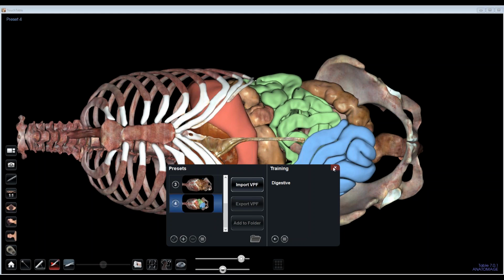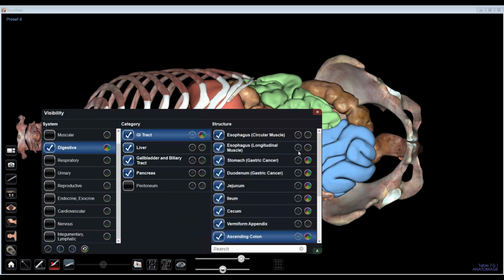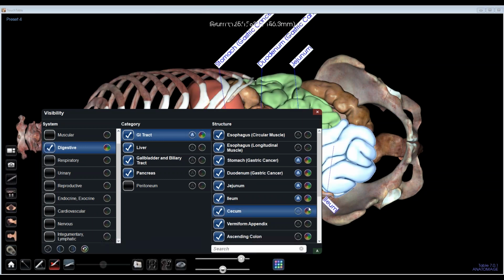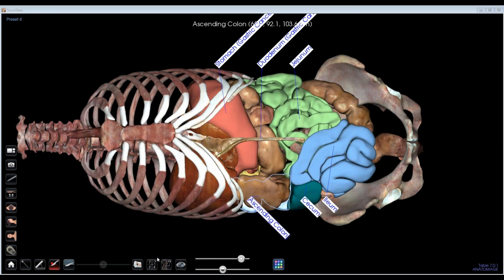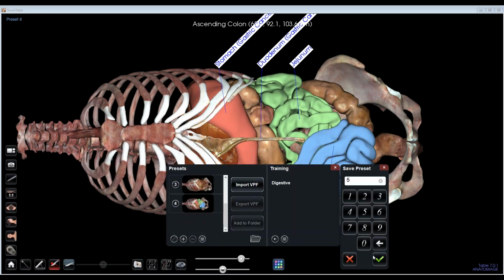If we wanted to overlay some annotations, you could certainly do that. Again, back into the eye. So notice that every structure that we colored now has their color wheel icon illuminated. So that's an indicator for you, telling you that you applied some setting there. So we can quickly just press the A here, and we can create like a question answer preset. So we've colored these structures, and then I'm going to save another preset with the 5.